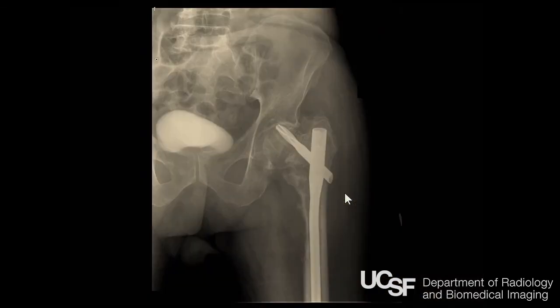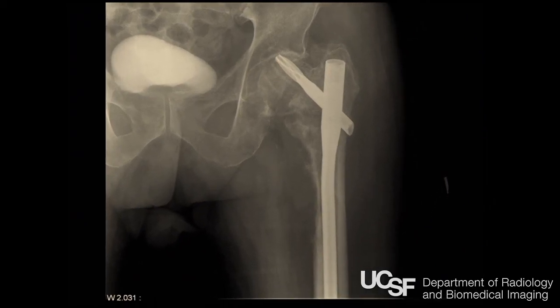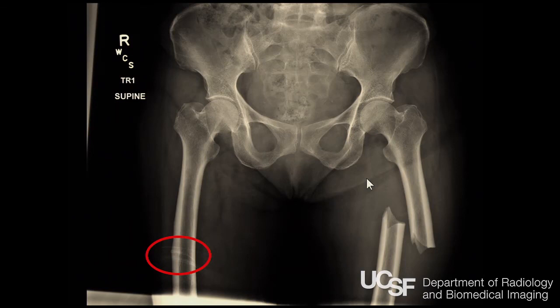When you're looking at fractures or trauma, pay special attention to the possibility that it's a pathologic fracture, especially if it's the lesser trochanter. This is a common site for metastatic disease, or it has a high association with a pathologic fracture. And you can see the eaten-away bone here. When you see a fracture here, you should find out if the patient's on bisphosphonates, and you should always look at the other femur. It's often bilateral. The other femur may only have this little tiny bump. That's all you'll see, but that's going to break too.